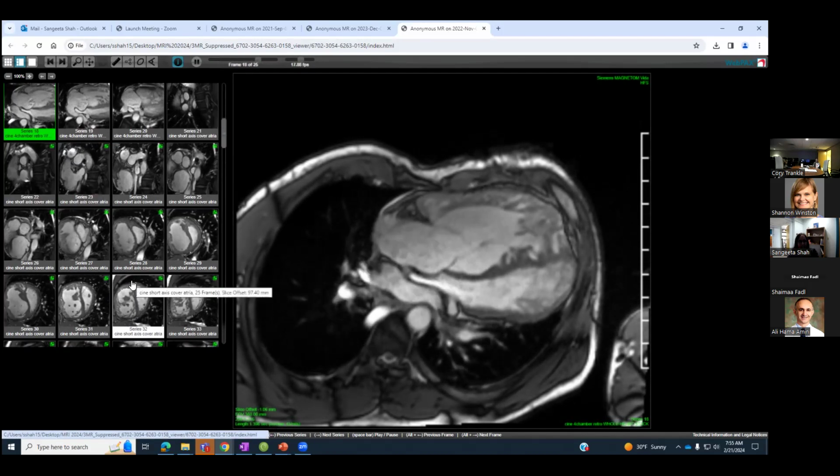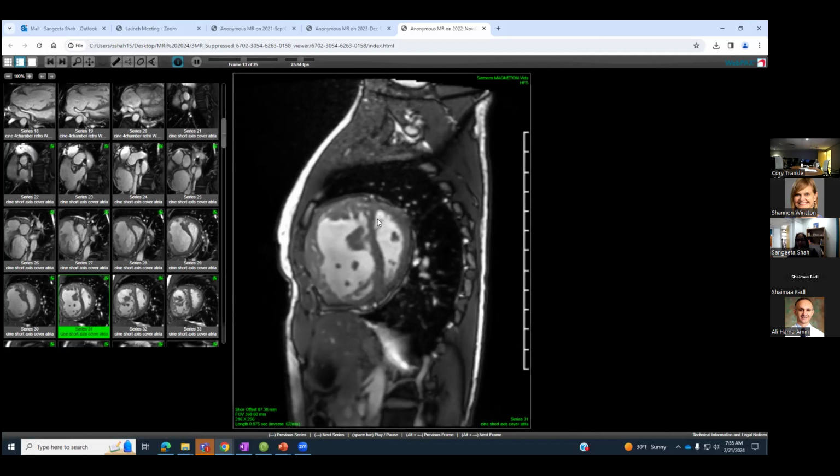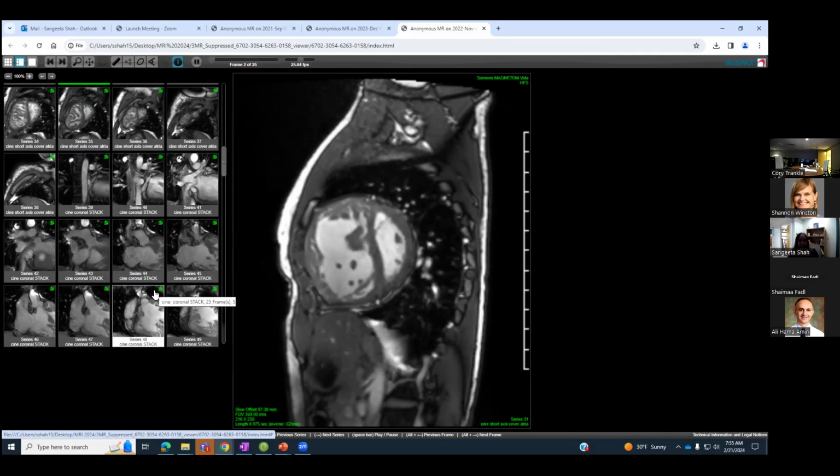And then 31. I put this in. I would call this ventricular septum very straight. This worries me. The RV is kaput. This is probably the lowest RVEF of the 3 patients that I show you today.